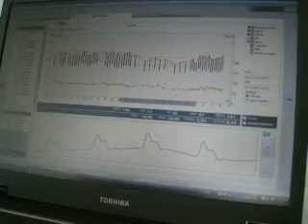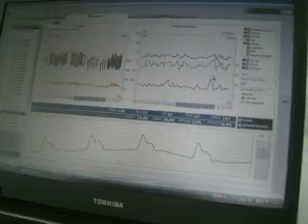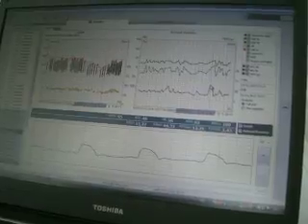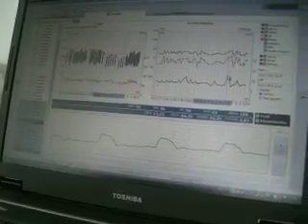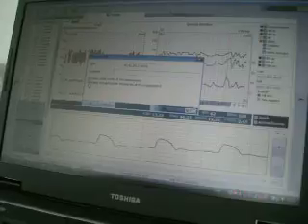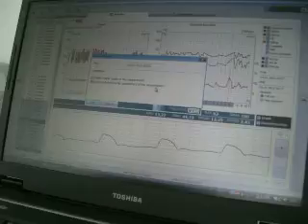One more thing, if you have an outlier here, like for example this pulse wave velocity you suspect was a result of some serious movement or some environmental disturbance, double click here and you can disregard the results of the arterial function parameters.